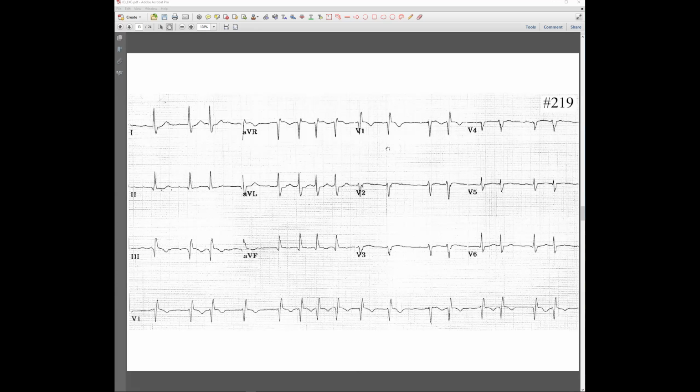And in only lead 3, you can see this Q wave, nothing else. This is why you don't have any MI, because if you talk about MI, you have to have the pathological Q wave in 2 consecutive leads, or in AVF and lead number 3, or lead number 3 and lead number 2, but only in lead number 3 and a negative one.